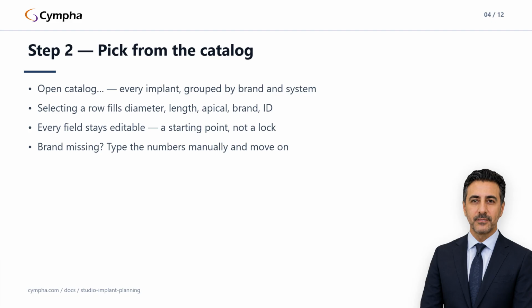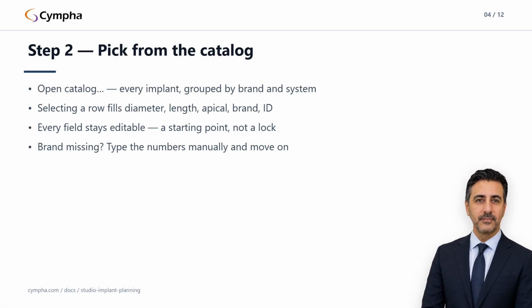The plan still saves and loads correctly. The only difference is it won't carry a catalog ID. And if you think the brand should be in the catalog, file feedback through Cympha. The catalog is updated periodically.